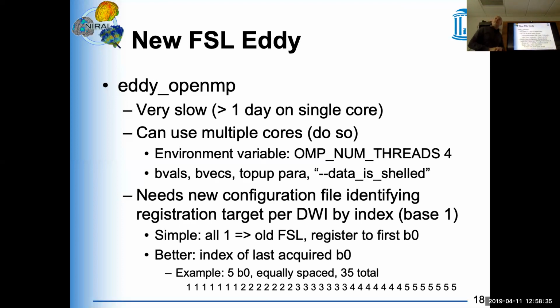I mentioned last week or the week before, in our sequences, the ones for Sarah's study, for instance, the first 2 volumes are B0 images. It's quite common. In that case, it would be 1, then 1 followed by 7 or 8 2s, exactly. And then if you have a PA concatenated to the AP, or vice versa, in the middle of that you'll have just one number followed by a pattern that looks like that.